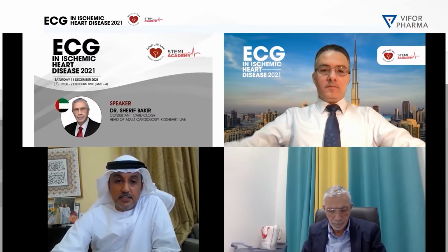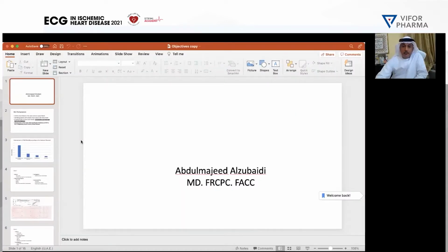And the format of this ECG session is basically, Dr. Bakir will give you his approach to reading an ECG, a step-wise approach. And then I will come back and go through cases where we present a case, and then we show the ECG tracing, and then we go through a specific message to learn out of it.